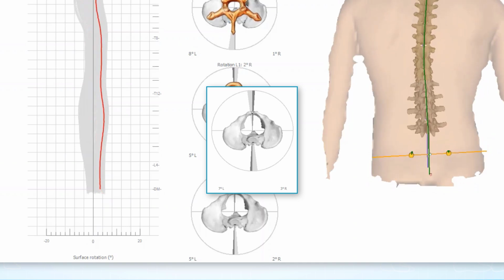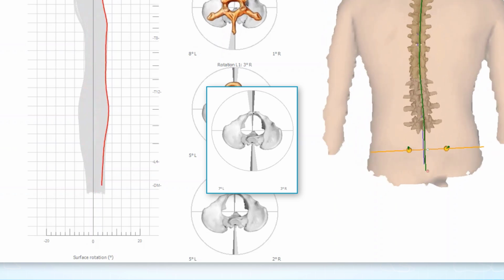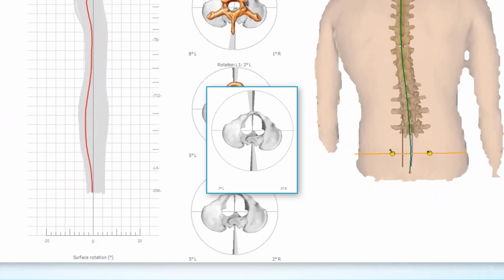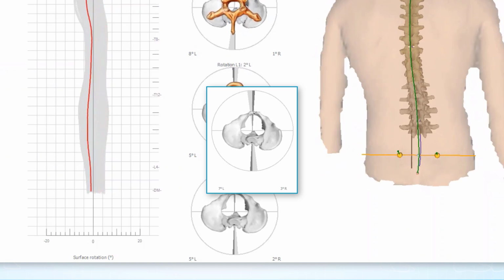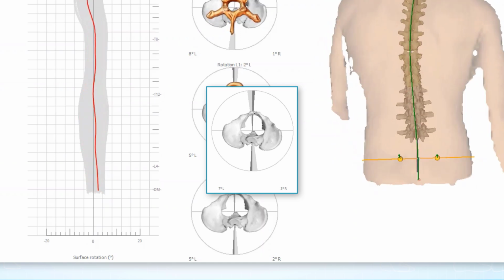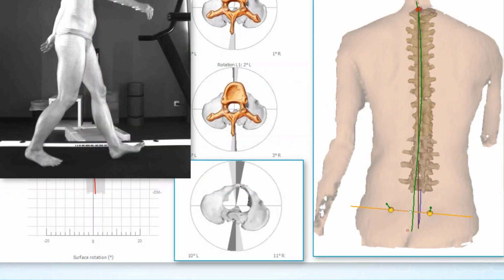The temporal sequence of the step development then allows a return from the increased rotation only up to a certain range. An increase in ROM on one side usually causes a reduction on the other. In total, it then remains at about 10 degrees again. It is therefore anything but atypical to observe an increased pelvic rotation of, let's say, 7 degrees to the left, in combination with a reduced rotation of 3 degrees to the right. Cases in which a ROM of 10 degrees is significantly exceeded or undershot are often far more conspicuous in terms of functional disorders and limitations.